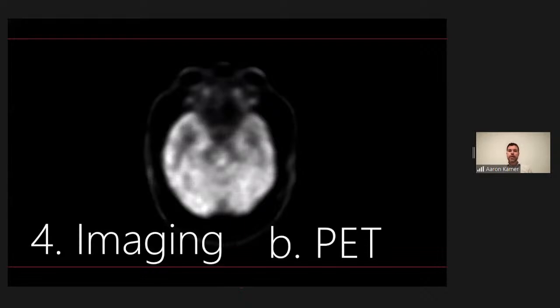Sometimes we will do PET scanning for our patients. Usually with a PET, we're looking for areas of hypometabolism, indicating a zone of our epileptogenic zone as being interictal. We don't tend to do PET trying to capture the seizure. We're trying to get it in the interictal period.